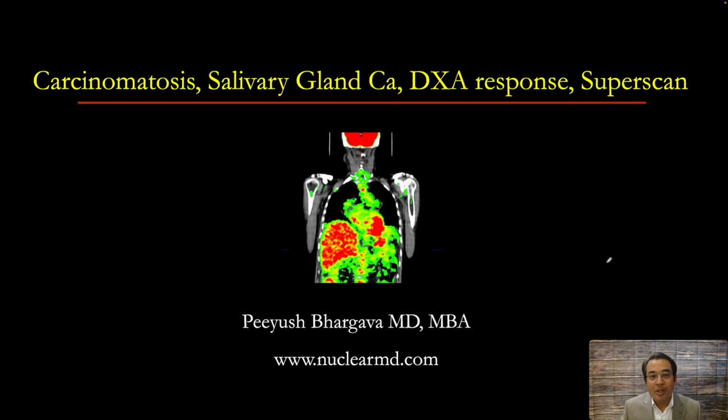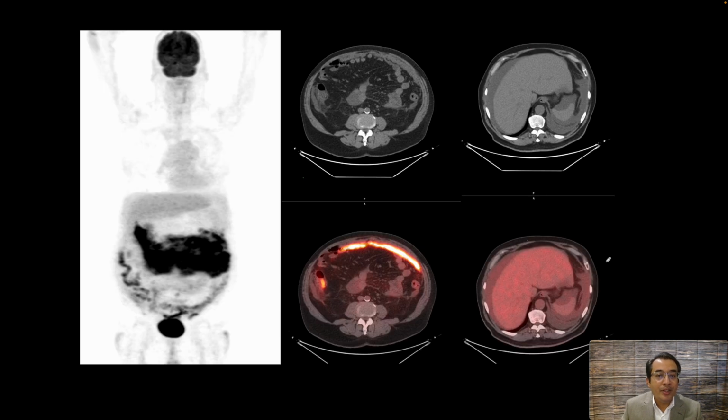Hi, this is Dr. Bhargava, and I have a few interesting cases to share with you in this short video. Our first patient has a history of lung cancer and presented for an FDG PET-CT study.